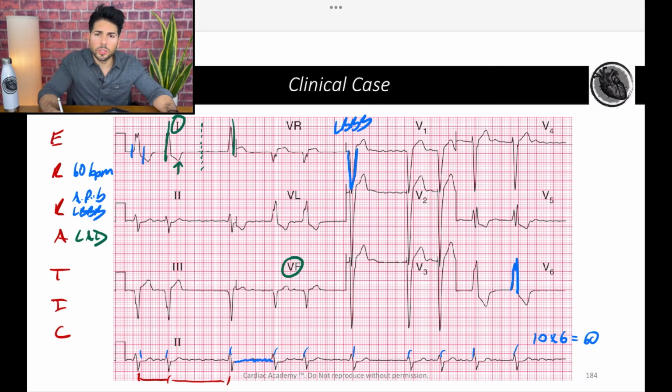Then I is for ischemic changes, and on ischemic changes we look for T wave inversion, ST segment elevations or depressions, and Q waves as well, okay? So let's start by looking, following the left lateral leads first. So lead 1, AVL, V5, and V6. And here we actually see some T wave inversions, right? But let me just clean this up a little bit.